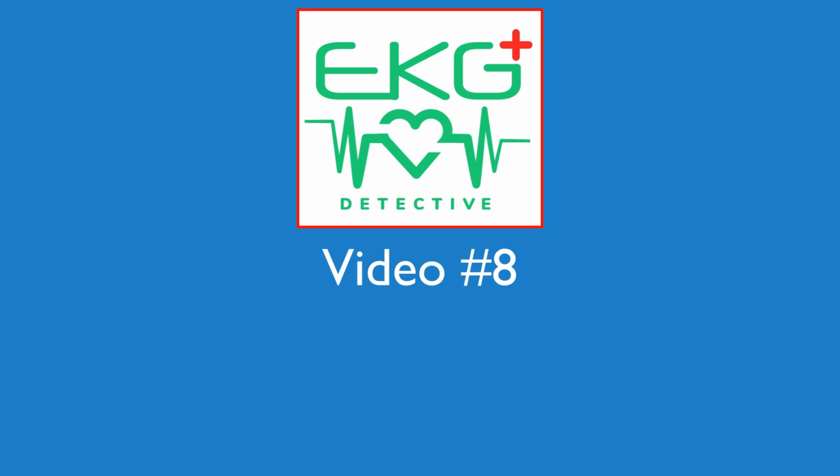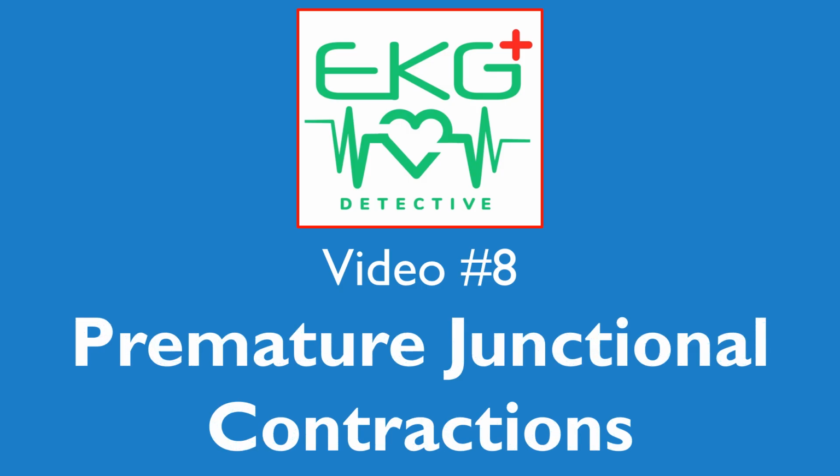Welcome to video 8 of the EKG Detective. For this month, we are going to be looking at premature junctional contractions.